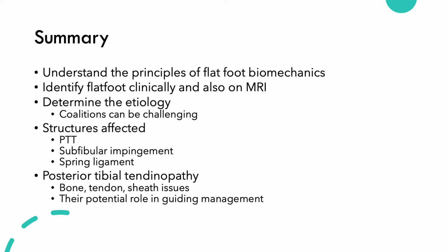And last but not least, when we look at posterior tibial tendinopathy itself, we're trying to determine whether the primary abnormality is at the bone, in the tendon. If it's the tendon, is it at the bone-tendon junction, or is it at the non-insertional aspect and the tendon sheath itself? And then we want to see how these can help us in managing these patients further.